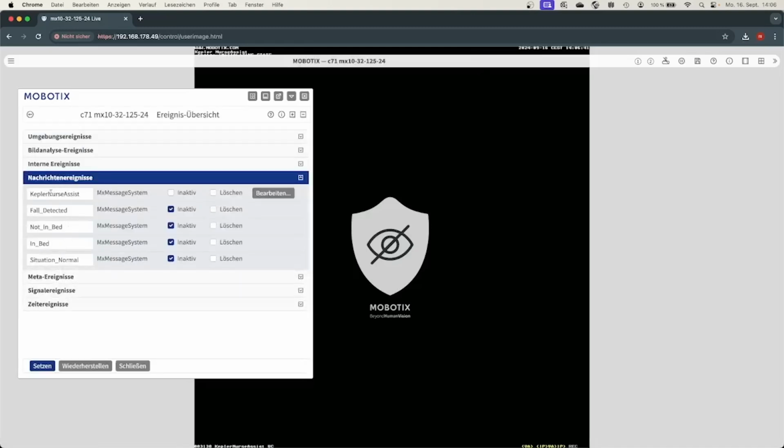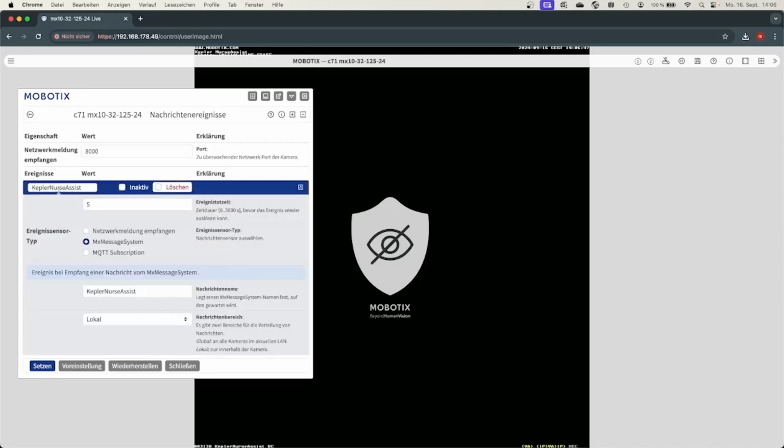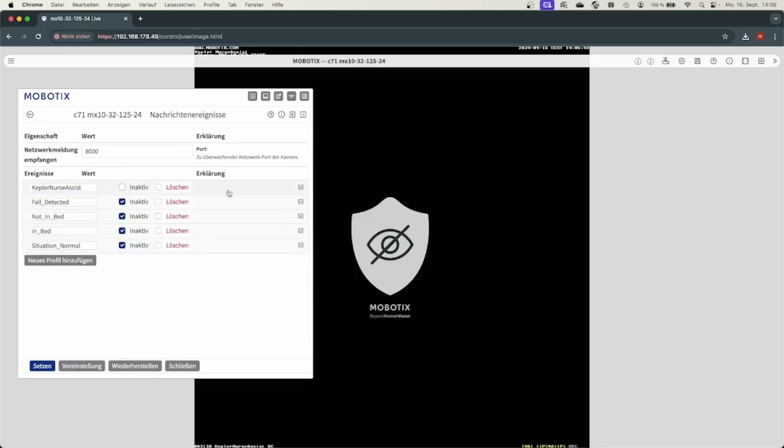In the event overview, you see we have several events already predefined, and only the Kepler NurseAssist is enabled by default, which sends the message when one of the Kepler events takes place, and then the system will send out a message to the system.